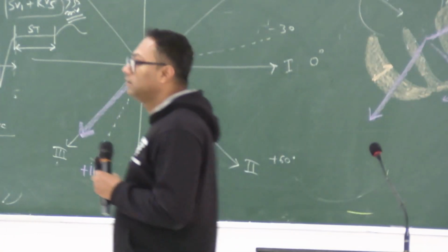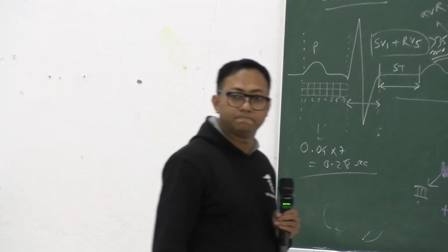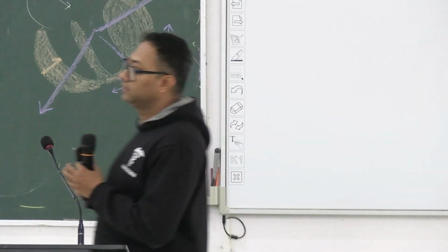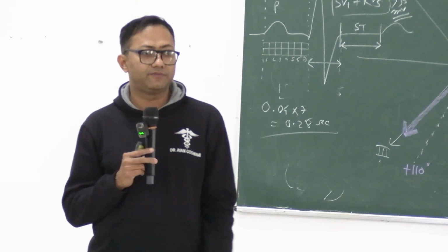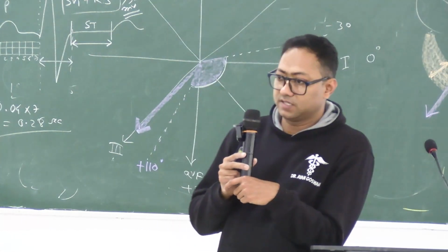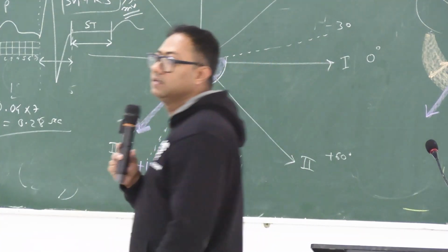Now, after the ST segment, what do we see? We see the T wave. Again, the T wave has many abnormalities. It may change in myocardial infarction, acute coronary syndrome. There are changes in T wave height. There might be T wave inversion, and also T wave changes in electrolyte disturbances. Okay. In hyperkalemia, it is peaked, in hypokalemia it is flattened. So that we will discuss, the abnormalities of the T wave, in a subsequent session, right?